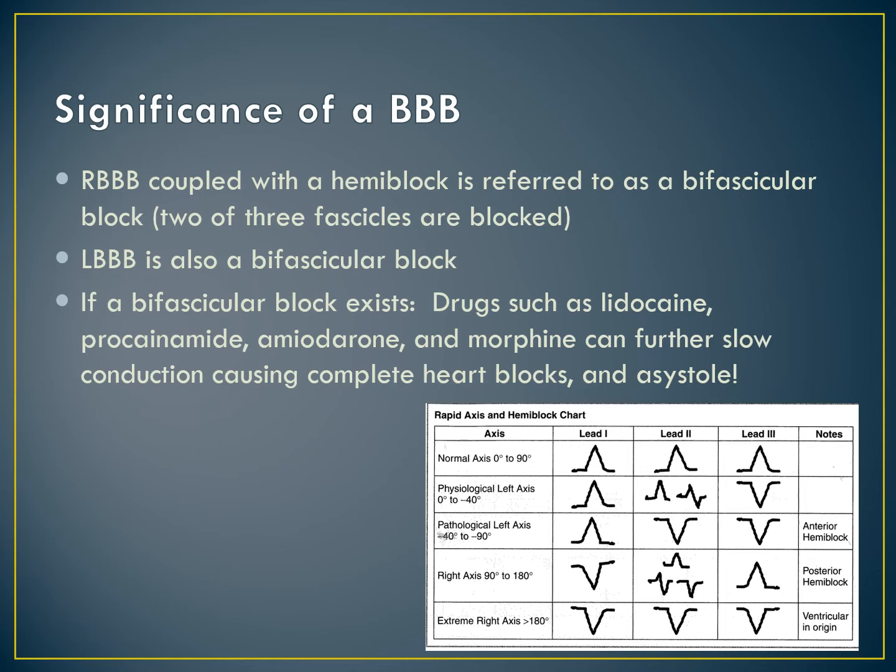Because the left ventricle has 2 fascicles, should you see a left bundle branch block in V1, you automatically have a bifascicular block. What's critical to understand is that the normal medications we use to treat some wide complex arrhythmias and some of our chest pain patients can cause further deterioration and potentially death. So it pays to be very vigilant and stay educated on proper diagnostics and treatment methods. And remember, always, when in doubt, confer with your medical command center and the physician for proper treatment choices.